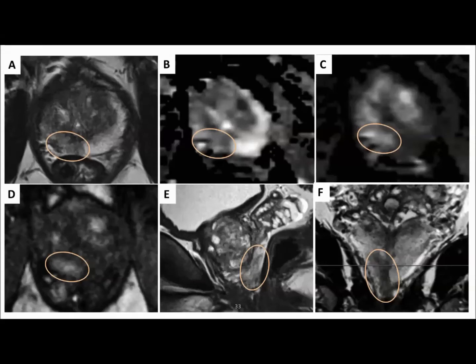So overall, considering a peripheral zone lesion, we should be looking at the DWI sequences. We do not see any significant diffusion restriction in this area, though we see some contrast enhancement, because the modifier for peripheral zone lesion is a dynamic contrast enhanced sequence. Then considering these two scores, it is a PI-RADS 2 lesion, indicating infection. So we do not see any suspicious area over here.